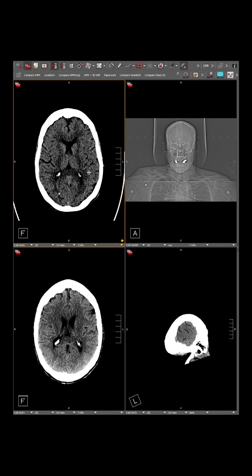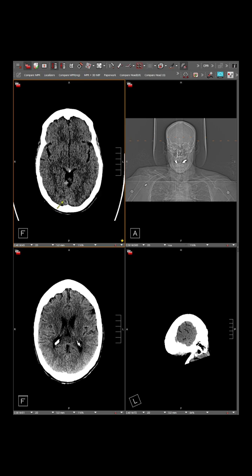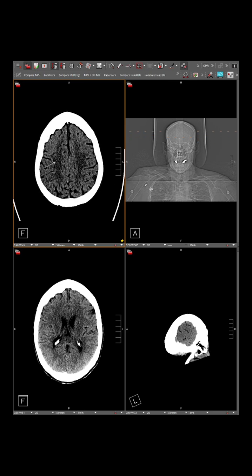And so when you're looking at a study and it's very complicated and you just want to remember certain things, but maybe you're just doing a first look and triaging, you don't want to report everything at once. You want to get the big picture. That's a nice way to annotate a whole bunch of things.